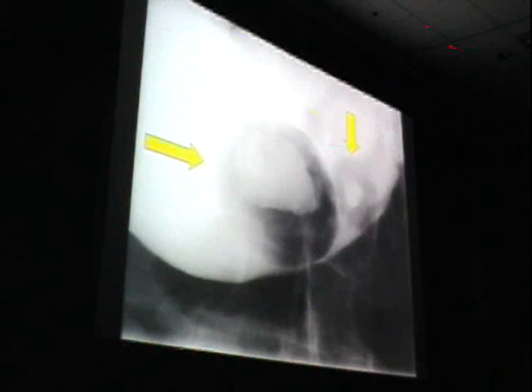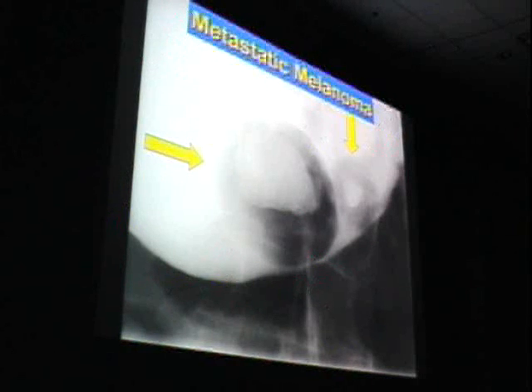Unusual, most metastatic melanoma in the stomach gives you multiple bullseyes, as we see here, and disease to the stomach. Unless it's direct invasion from pancreas or something outside, if it's hematogenous, we usually see multiple metastases. And the most common thing to do this is metastatic melanoma.